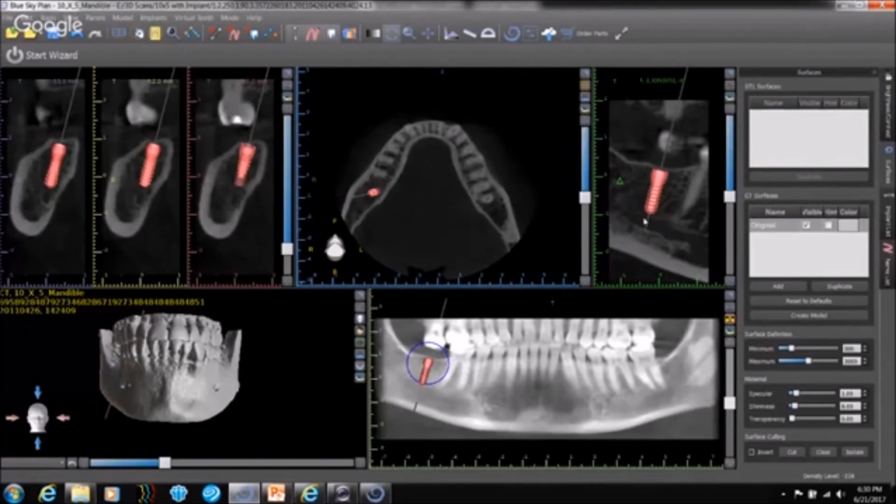The canal is much more well defined. What you see over here is an implant area and an implant site that is in consideration for implants. Now, in this case, if you look at the cross-sectional slices, see how good and intact the cortical slices are. They are absolutely intact over here. They are very thick, which means it's very healthy bone. And you also see a lot of cancellous bone right over here.